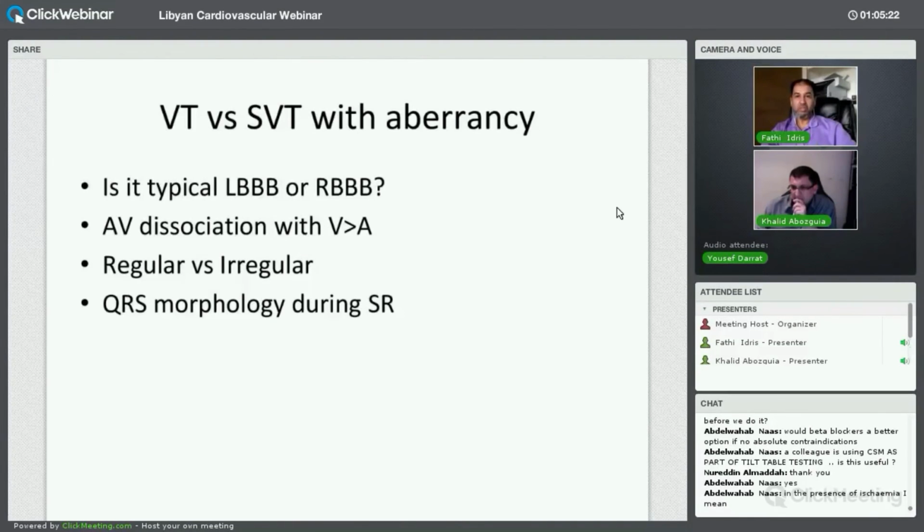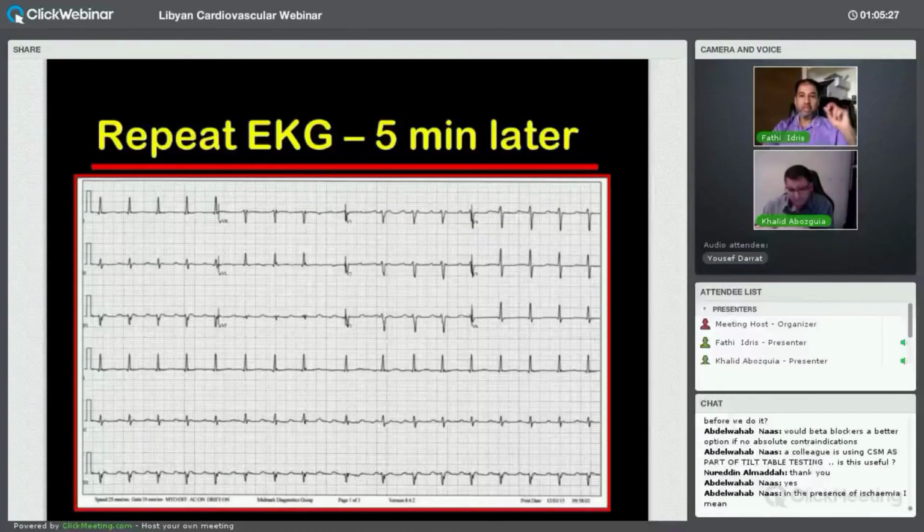Khalid, let me just clarify something. When I said lead V1, I meant earlier on. I meant V1. You can collect a lot of information from lead V1. So back to this case, back to the discussion. That's true. But in this very case, if you have lead 2 only, I would think this is sinus rhythm, right? I think it's very subtle to pick up changes here. But if you look at lead V1 here, you can tell there are variations in even the morphology of the R prime itself. You see R prime here versus here, and the PR interval is quite easy to pick up here, because here you know where the distal P wave ends compared to the QRS complex.